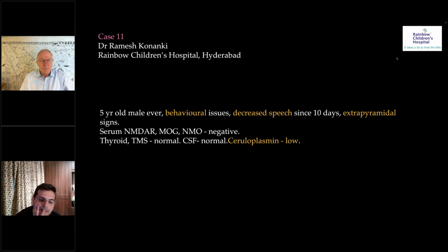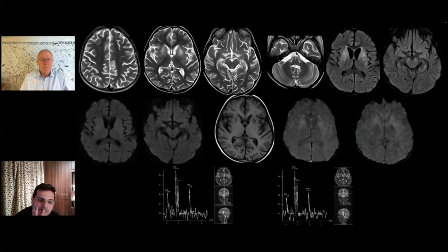Why not just add them? This is the second scan, Dr. Kavita. I think the first scan also had a similar change. First scan also has similar changes, ma'am. Okay. And in biotin thiamine, won't the thalami be affected much more prominently? Yeah, much more common in the cortex. Because here the thalami are completely spared, no? Kavita is also right.